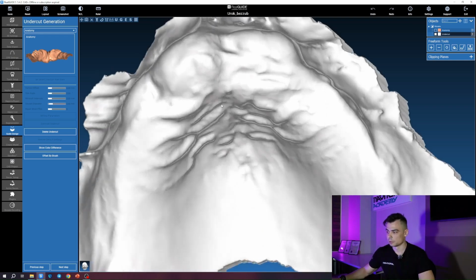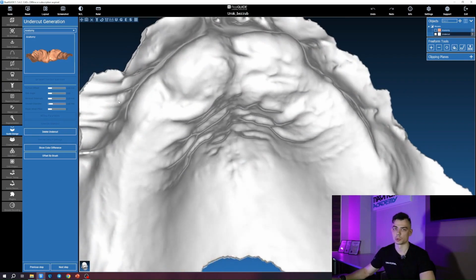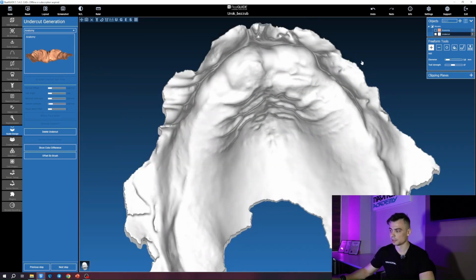That's why, for example, here we see some questionable areas, because these kinds of dips in the mucosal contour generally resemble a socket that will most likely heal over. So similar to working with a plaster model where we had bubbles, we can click the plus tool, that is add. I'll make it a little smaller now, and then accordingly I'll locally fill in these areas that make me unsure whether teeth were actually extracted there or not.